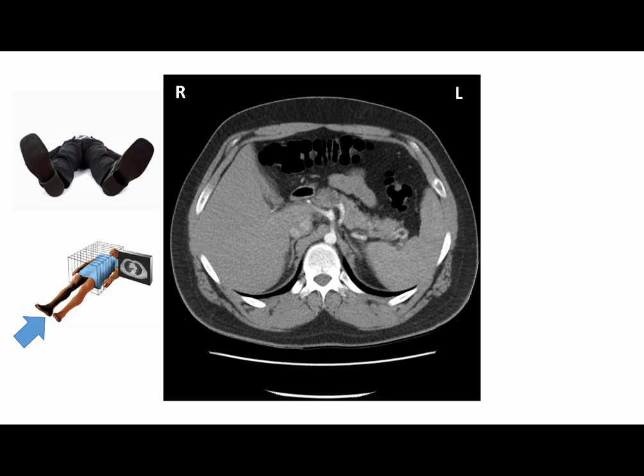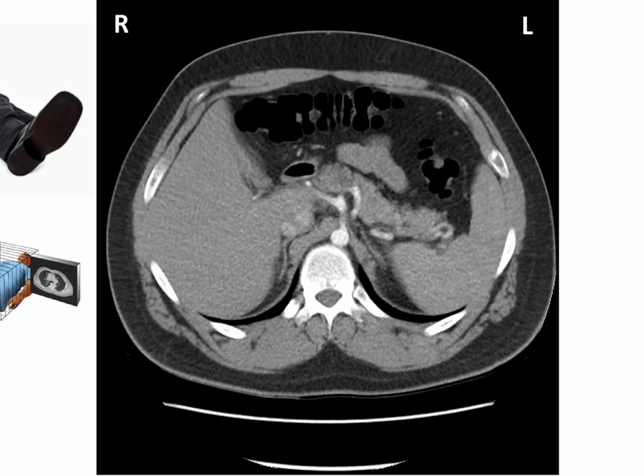This CT is of a 25-year-old male and contrast medium was injected prior to acquisition. Typically, contrast medium is an iodine-rich solution injected into the patient via an antecubital vein, which allows us to better visualize vessels. In this case, the medium was allowed to travel to the right heart, to the pulmonary circulation, the left heart, and then to the arterial system before the scan was taken. This allows us to see the arteries, so we say this scan was taken in the arterial phase.